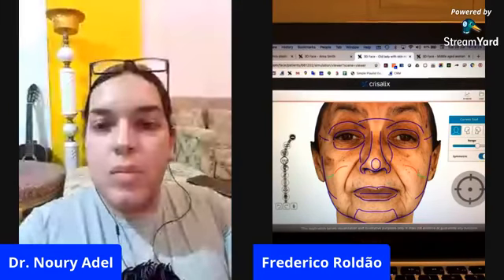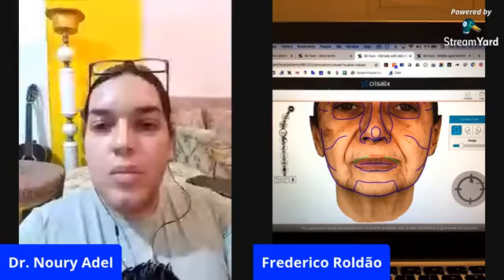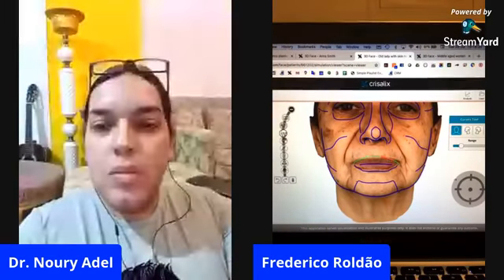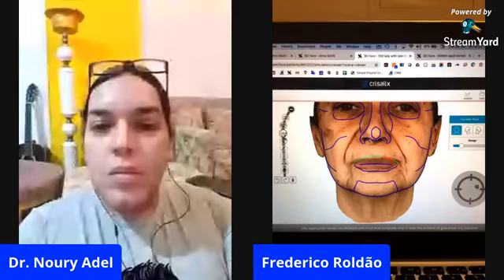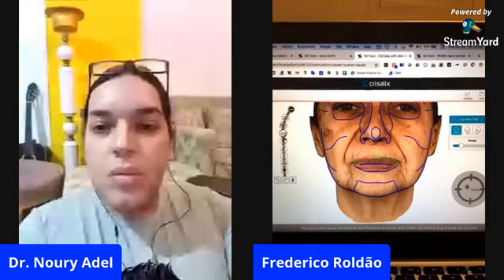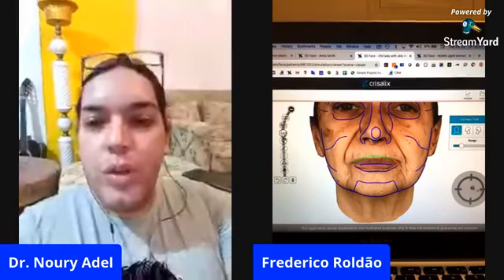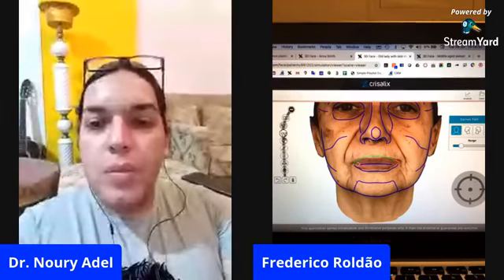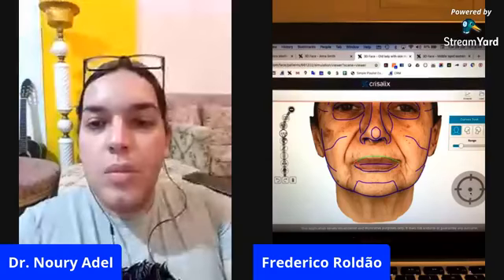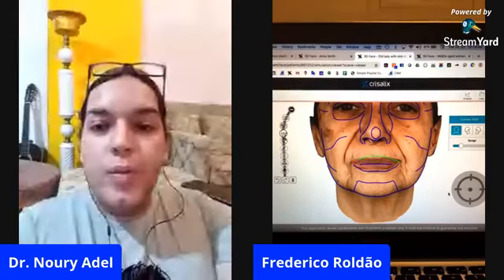I will also try to do something to her lips and make them look a bit more plumped with a bit more volume. You are lifting the tip of the cupid's bow for her. Can you repeat, please? Sorry. You are lifting the tip of the cupid's bow for her.